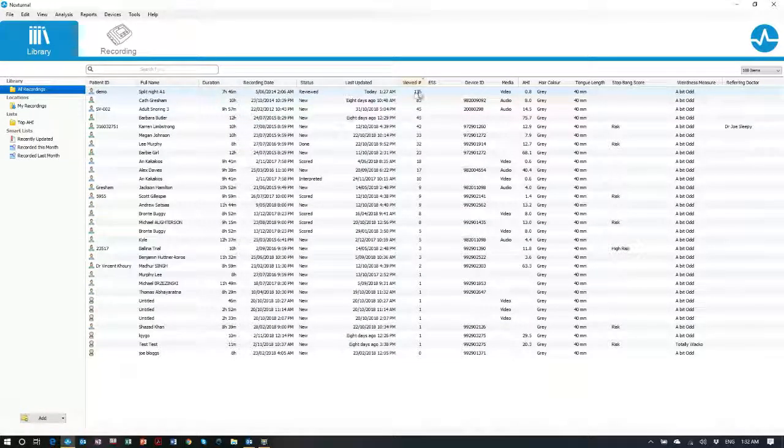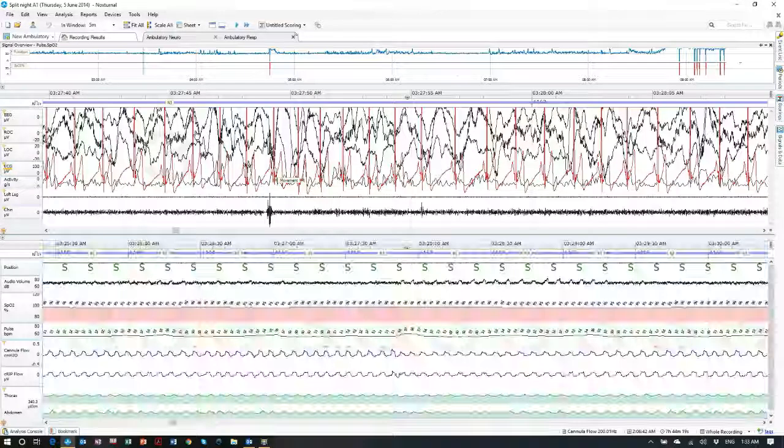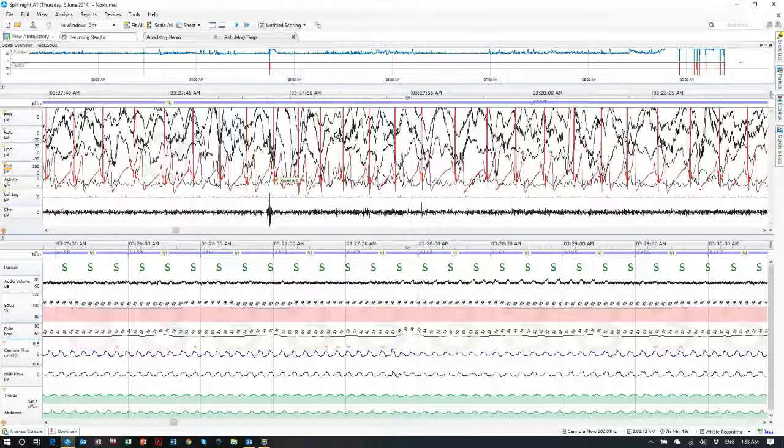Hit it twice, and there's one that I've viewed 135 times. That's because it's one of the examples I used. It's not named, so there's no confidentiality problems there, and I can just then open that up. Incidentally, this is a split night study. It's a full online PSG study with video and everything, so it's quite nice to show people.